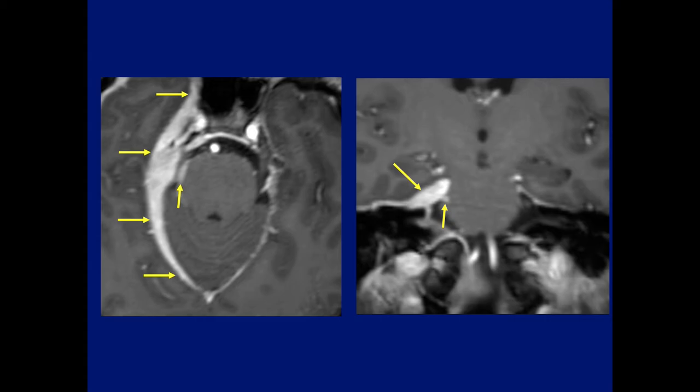Several people, Asif and some, let me see who else mentioned that. And Eric also mentioned sarcoid. And this was a diagnosis that our department came up with for a while. And actually, this case was listed in my collection as a sarcoid.